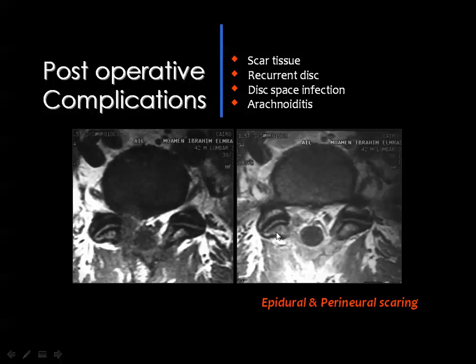And you see that there is a spinal laminectomy with the thecal sac decompressed, sagging through the laminectomy defect. Actually, within the enhancing scar tissue, you will identify the nerve root. And this is, of course, the nerve root, because on the opposite side you have the corresponding nerve root. And you should also know that the nerve root, which is entrapped within the fibrous scar, will not look similar to the normal nerve root. It will be swollen and may show some contrast enhancement.